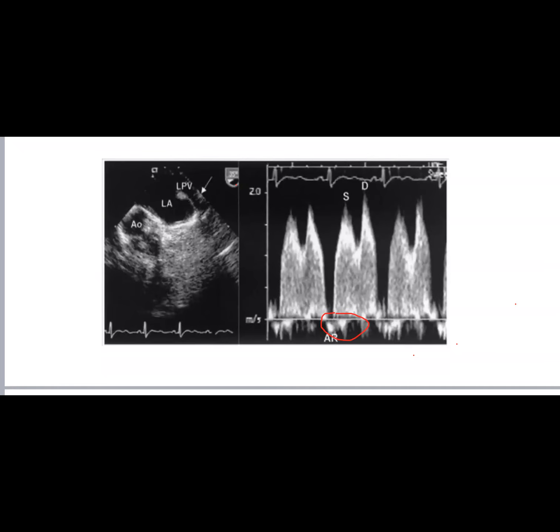Yes. So these high velocities are so high. Usually it looks like this. Now see how much they are? Big difference. So these high velocities are the result of stenosis. Okay, pulmonary venous stenosis. And the most common reason is? AF ablation. Exactly. Yes, AF ablation. Okay. So great.